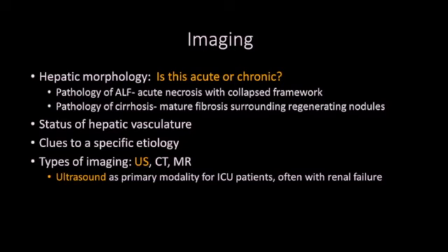Regular cirrhosis has lots of fibrosis and also has some regenerating nodules, but it's the fibrosis and the nodular contour that is characteristic. So in very hyperacute liver failure, the liver just collapses, but it may seem normal to us on imaging. Cirrhosis, most people know what that looks like: fibrosis and regenerating nodules.